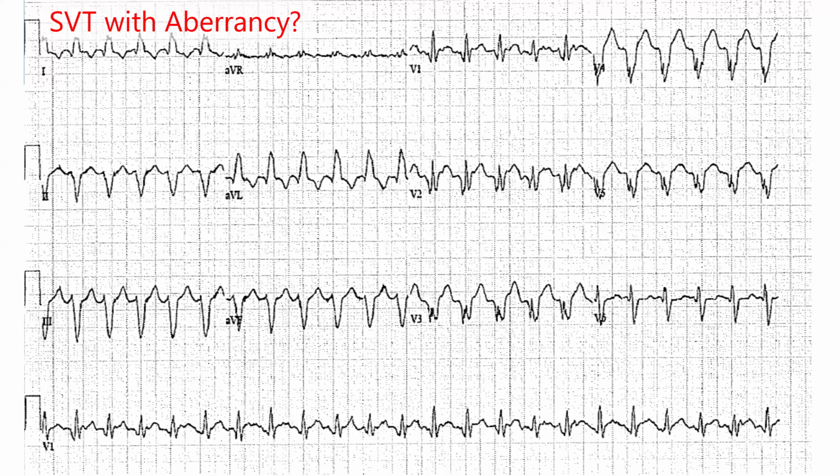Last question: is this atrial fibrillation? We know that the person has that. Is this atrial fibrillation? Well, if you take a look with calipers going across the rhythm strip at the bottom, the RR interval is utterly constant across the tracing. And as you all remember, in the context of atrial fibrillation, what you're expecting to see is nearly continuous variation in the RR intervals, consistent with the inundation of the AV node with the very rapid and rather chaotic electrical activity found in atrial fibrillation. So this is not that.